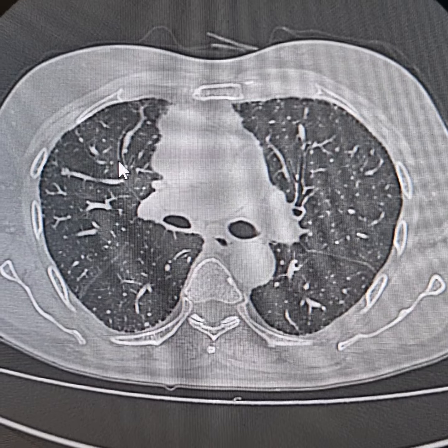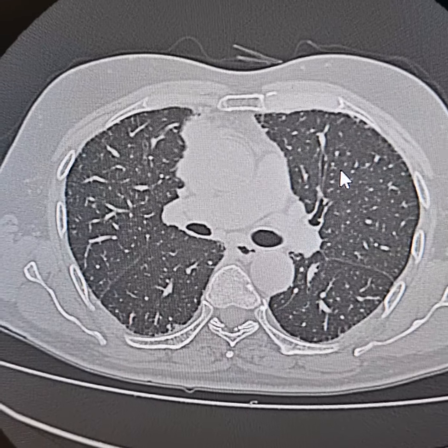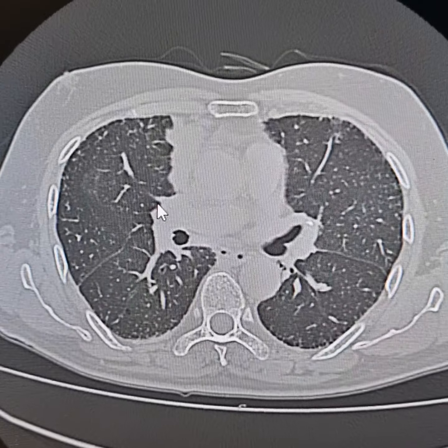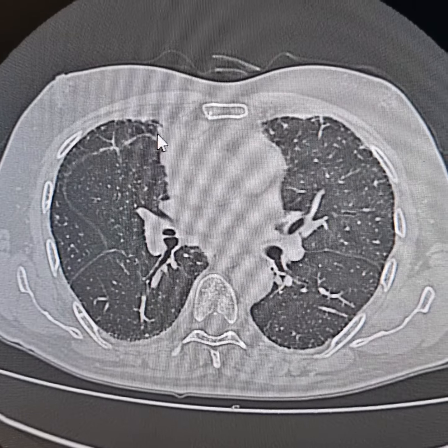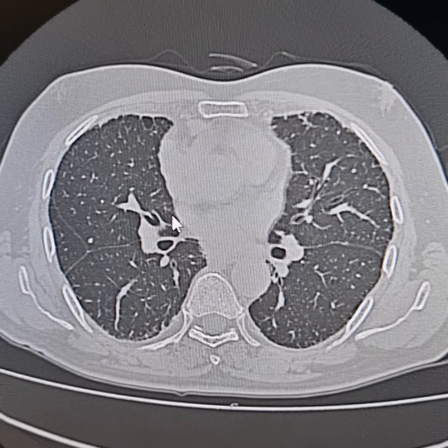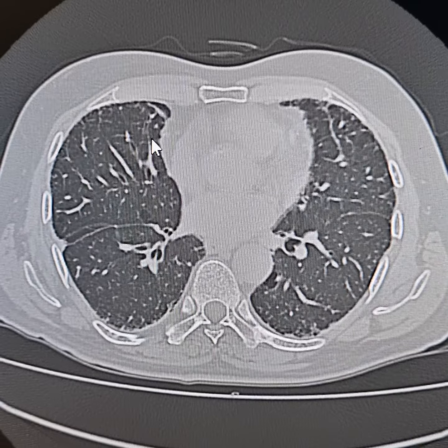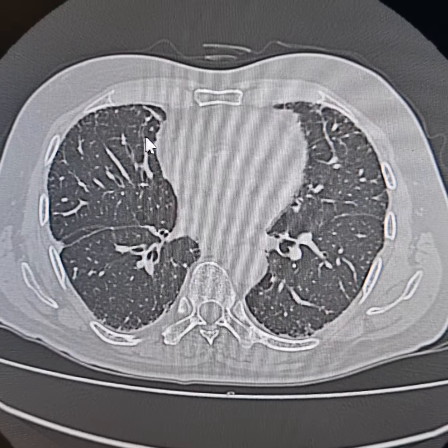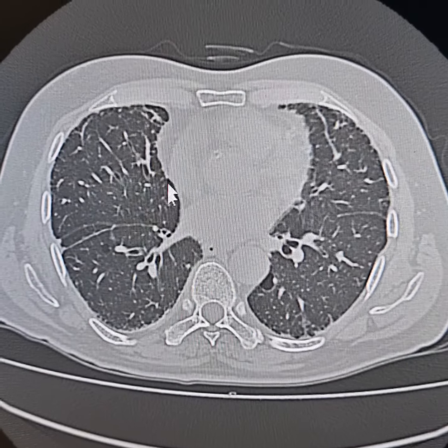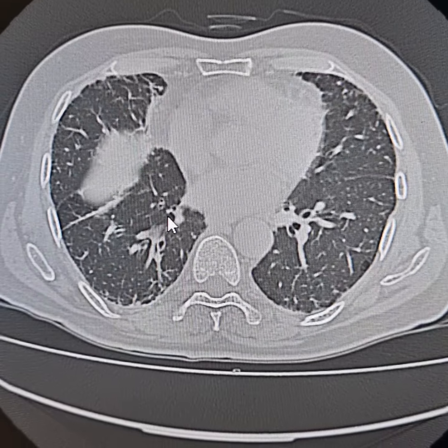Please observe the tubular configurations of these bronchi in the anterior segments of both upper lobes, suggestive of early traction bronchiectasis. Small interlobular, intralobular septal thickenings. Please observe these tubular configurations of bronchi, which are extending quite to the periphery of the lung in both the segments of right middle lobe.